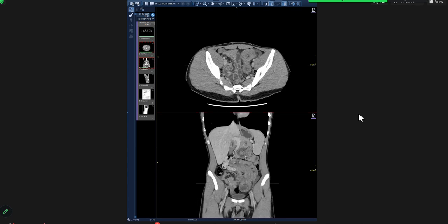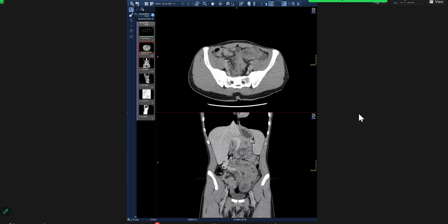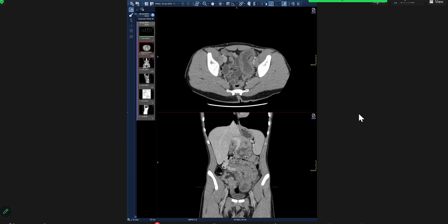There is a thickened bowel loop seen in the left iliac region, along the left iliac blade. It has a bowel-within-bowel appearance with a well-defined lesion seen in the end.